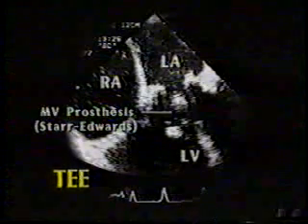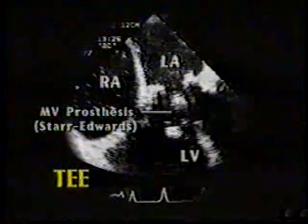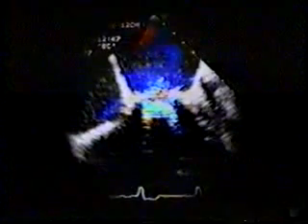Accurate assessment of the functional integrity of prosthetic heart valves is a clinical challenge that can be answered comprehensively with echocardiography. As with native valvular stenosis, the addition of Doppler has been a tremendous advance in delineating the hemodynamics of prosthetic valve function and dysfunction. The more recent application of flow imaging and transesophageal echo to the study of prostheses has been particularly useful for assessing prosthetic regurgitation. By using an approach which integrates all of these modalities, we can completely solve most diagnostic problems related to valvular prostheses.